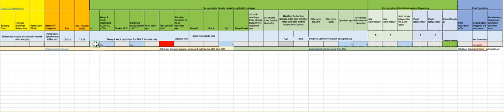That's fine because it's an average axial length. But what happens if I put a very low axial length, a small axial length? It gives me a red flag over here. It shows that this may be beyond the average eye, so it gives me a check mark over here.